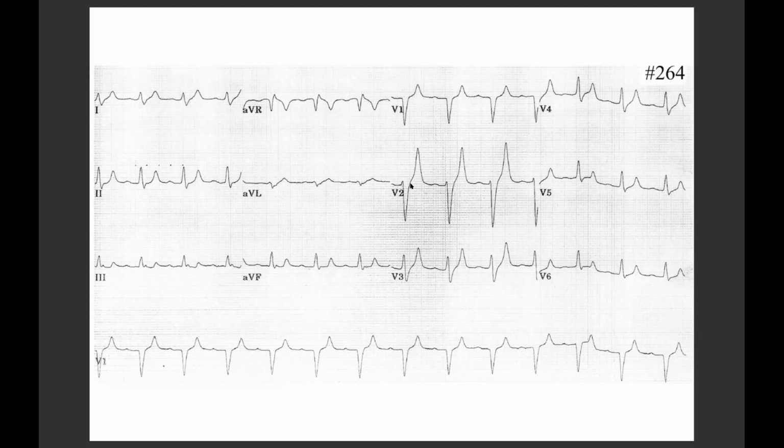No, I don't think so, maybe 3 or 2.5, so it's borderline. But it could be wide as well, and especially if you focus on the P wave in lead number 2, a little bit flattened. Yes, true. So far we do have a flat P wave, elongated PR interval, a little bit wider QRS complex.